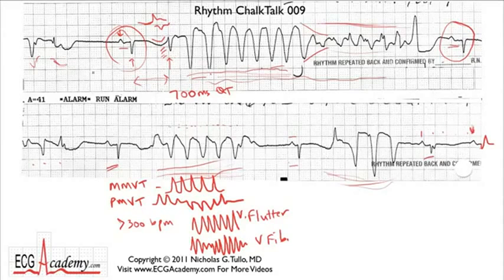So it's 700 milliseconds, and then this tachycardia starts up. What's the first thing you really need to think about? Look, you've got a long QT interval. You have a polymorphic VTAC. Almost certainly what this is, you guys know, right? Torsade de pointes.